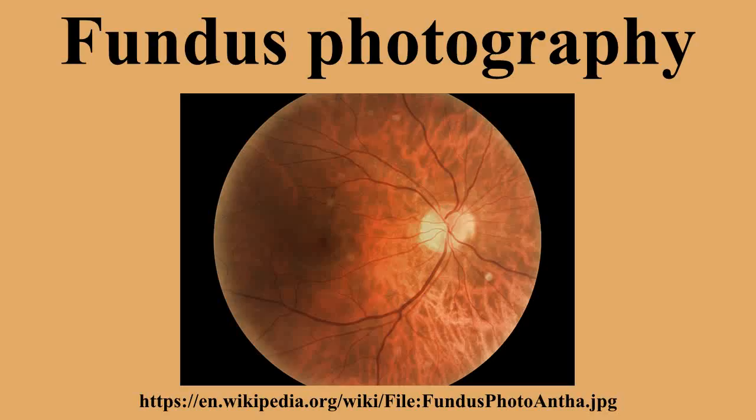among other conditions. Simultaneous stereo fundus photos were published prior to 1909, however the use as a diagnostic tool is not widespread. Recent advances in digital photography and 3D monitors have seen some manufacturers incorporating it once again into photographic equipment. The current process involves simultaneously photographing the retina from two slightly different angles. These two images are later used together to create a 3D image. In this way, the image can be analyzed, giving better information about surface characteristics of the retina.